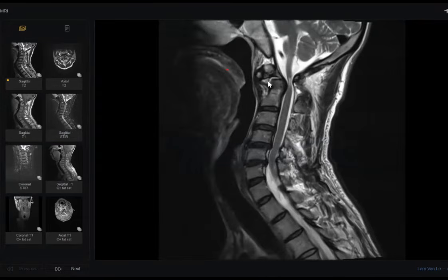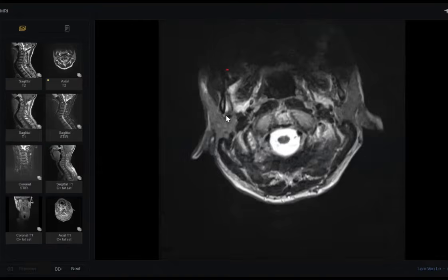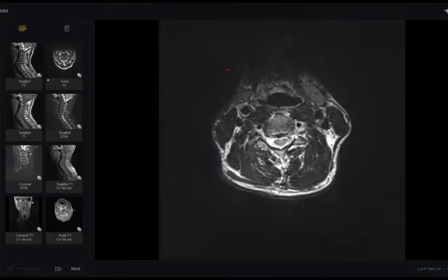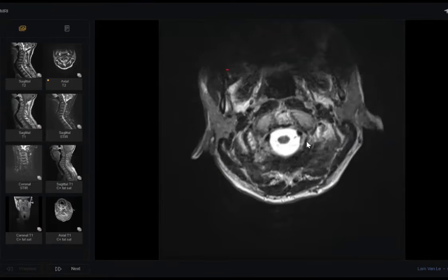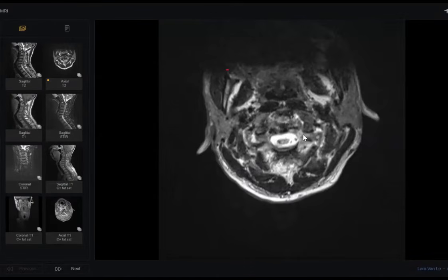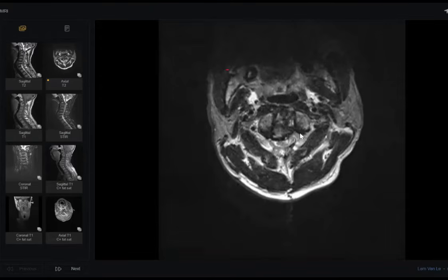I would like to know the history of any inflammatory arthropathy in this case to further delineate, because this can happen in rheumatoid arthritis as well. However, rheumatoid arthritis is associated with pannus formation. Sir, can I see the axial images to further see the subluxation? Yes, sir. In the axial sections, the demonstration of the narrowing is noted with cervical myelopathy.